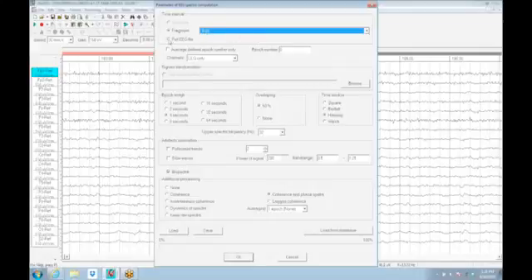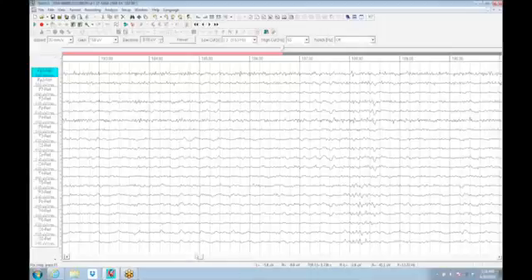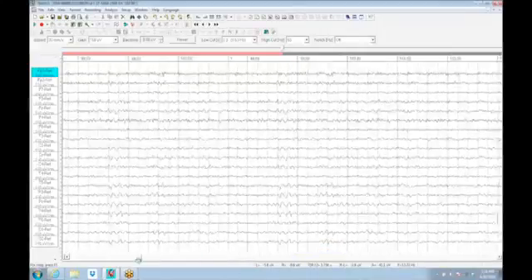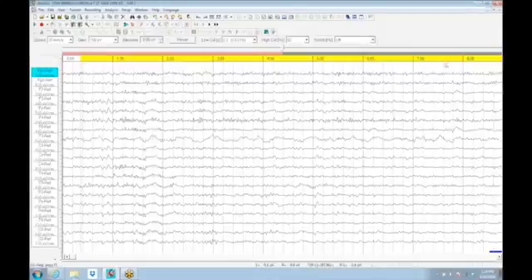In this circumstance, we can analyze the full EEG, or I can find a segment. Let's say I was interested, if I thought T3 was really a slow wave, and I wanted to analyze this separately from everything else. I can catch a selection and then analyze that selection.